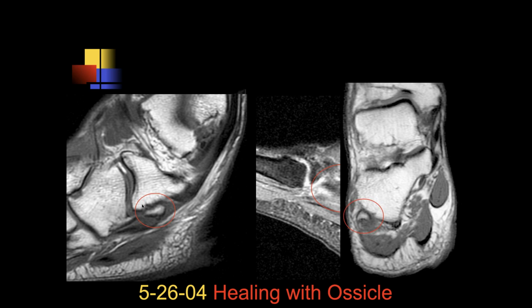This is not a complete avulsion then? No, there's nothing avulsed here. This is all within the body. I understand. It's a tear, but it's not a complete tear. Correct. It's a partial tear. It's a residual of a partial tear. Right.